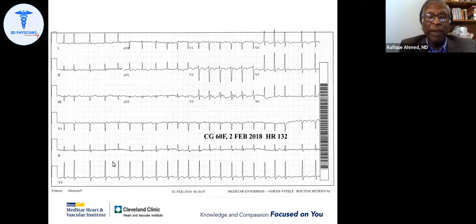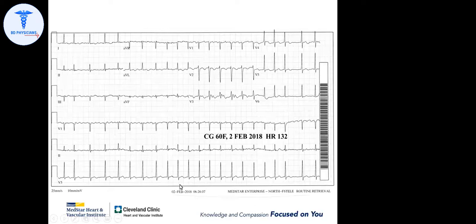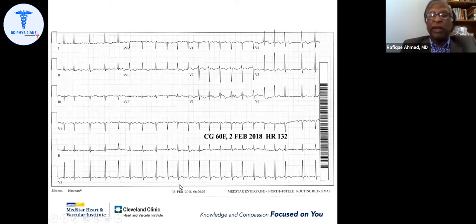And I have a bigger picture of this. Now we can see the irregularity, right? Yes. So, sir, please keep in mind that atrial fibrillation, when the rate gets too fast, may look regular. But even when it looks regular, if you put a caliper over it, you will find that it is irregular. So again, this is atrial fibrillation with rapid ventricular response and non-specific.